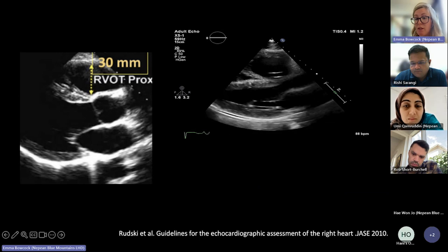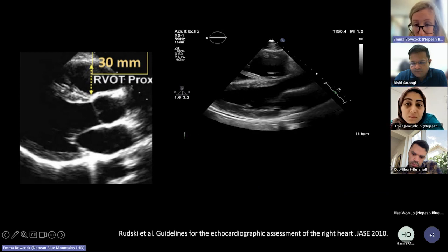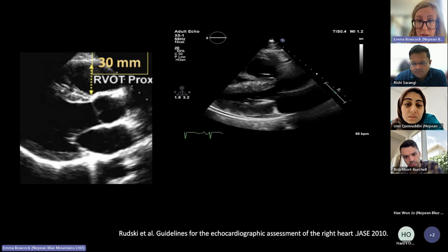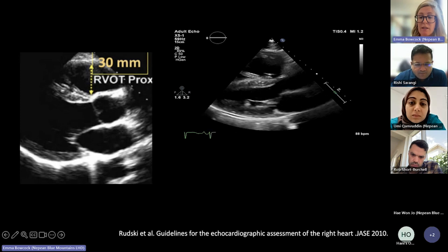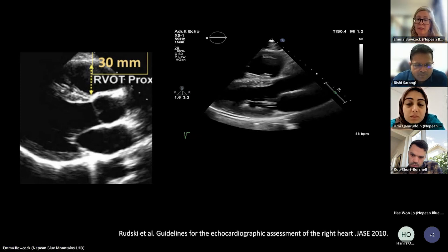What other things do you notice on this? Who have I got? It's quite annoying. I can't see you all. There you go. Hi. Rishi, what do you want to just comment on what you can see in this picture? Like some of the pertinent features about the RV?